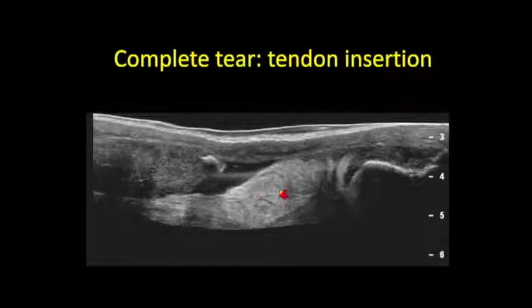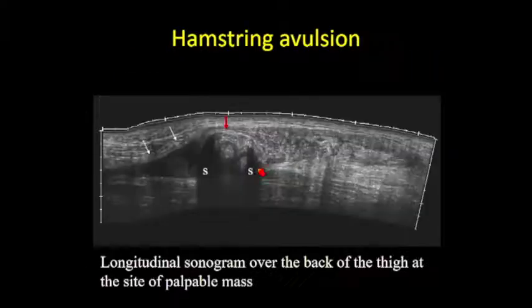Alternatively, when we have disruption of that containing structure, you expect to see herniation of the adjacent soft tissue into the defect. So here's another complete rupture of an Achilles tendon, actually from an enthesophyte, that we can see retracted proximally, and we see hypoechoic fluid over here, but we see herniation of the fat, the retrocalcaneal fat, into that defect where the tendon used to be.